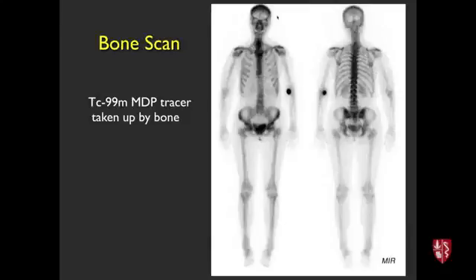So here's an example of a bone scan, and the photons travel, but they disperse fairly quickly. So an anterior view like this one is not the same as a posterior view, okay? Because of the different detectors, and because of this dispersion.